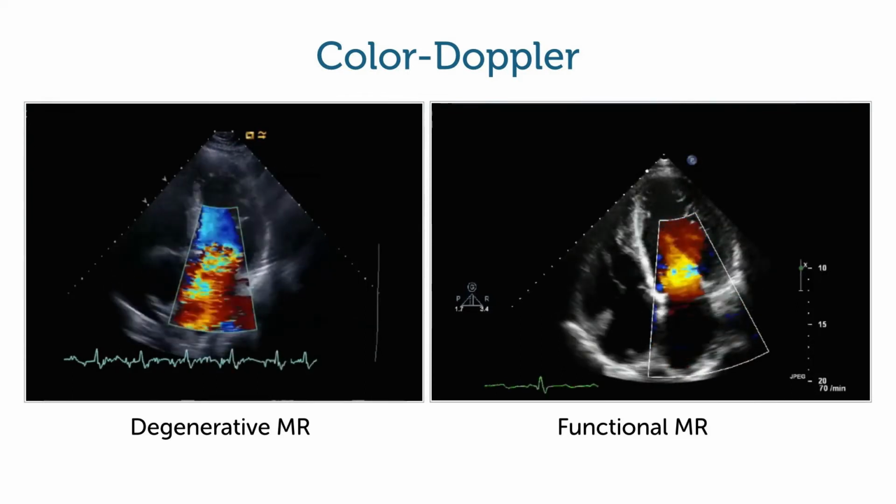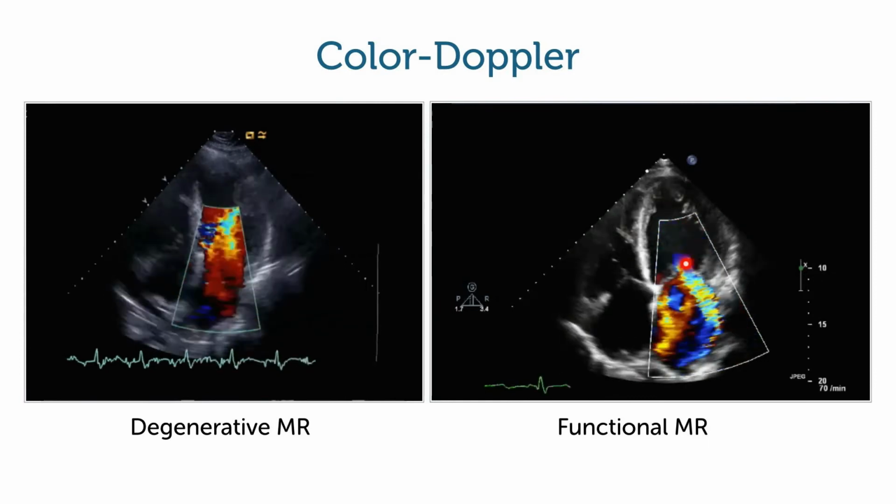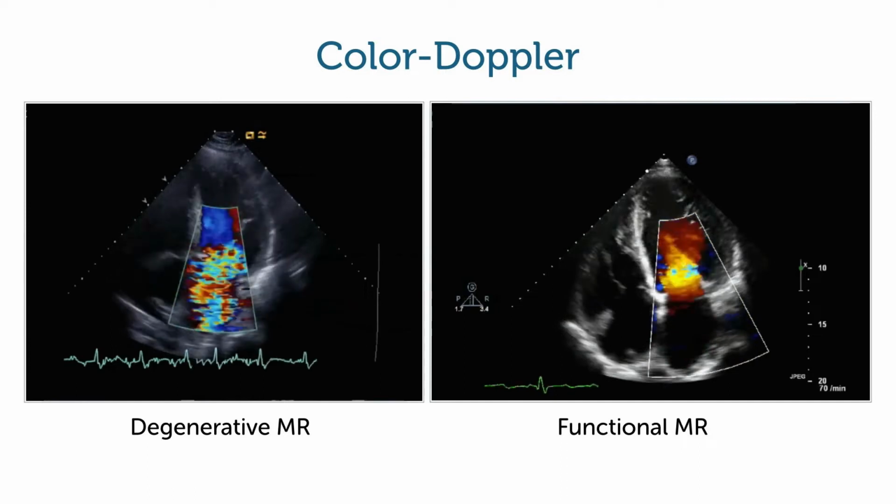We'll talk about that in the main course, but here, just for you to understand, this is a marker of severe MR. And then we have the different orientation of the jet, which actually helps making the diagnosis, understanding the morphology of the valve, but will come also later on. We'll come to that, but it's a very good point because the direction of the jet will be very important later on.